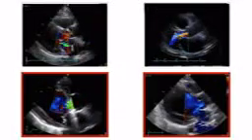But again, this is very difficult to assess because it's a very eccentric jet. It might not appear like a lot, but you can see that it's eccentric and impinges here on the anterior leaflet. And if you ask me which of these jets has the biggest consequence for the patient, I think it's this one and this one here. They're moderate to severe. Good, so you saw some examples.